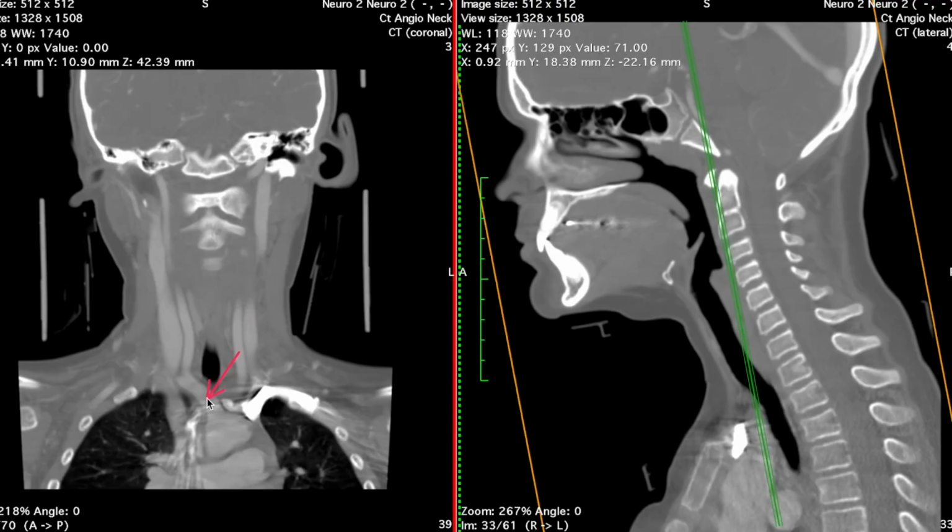So to remind ourselves, this is the brachiocephalic. We're going to be talking about the right common carotid, that branch that's coming off superiorly. The left common carotid also does the same thing, but I just thought the right common carotid looks better in this image to show you the bifurcation of the common carotid artery into the internal carotid and the external carotid. One thing I'd like to point out is there's this large vessel lateral to the common carotid artery. This is the internal jugular vein. It's going to be really close to your common carotid artery because it's within the carotid sheath.